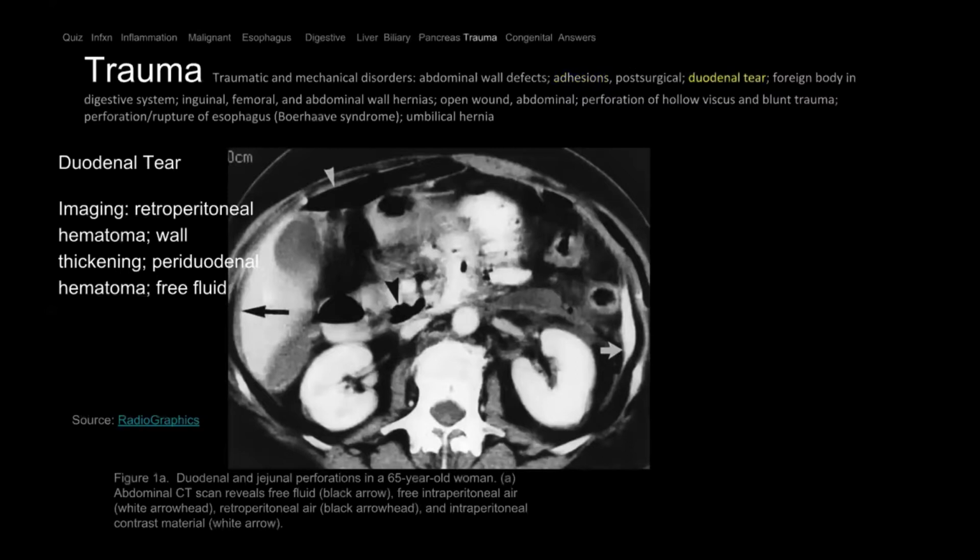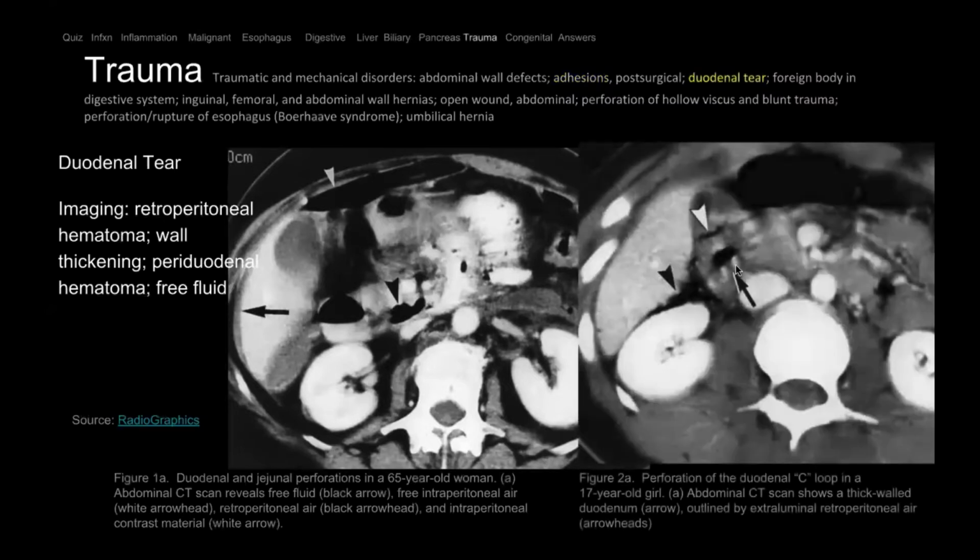Trauma. Okay, so trauma, high velocity MVCs, motor vehicle accidents. Here we have a contrast enhanced CT, so there's blood around the liver. There's free air. This thing up here is free air, and it looks like there might be contrast extravasation here, maybe active extravasation.